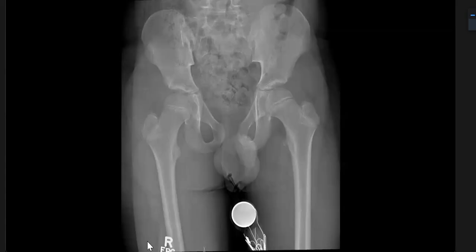I would like to know if the patient has any prior history of any long-term condition. No. Can you please show me where the osteopenia is? I've given you the mouse. Can you please show me where is the osteopenia you just mentioned? Here. I can't see the mouse hovering around. Oh, you're able to control now. So show me, please. Here. No, that's the normal bone contour.